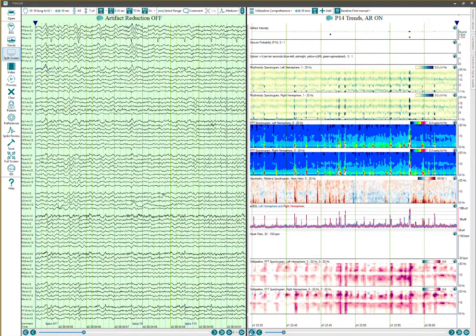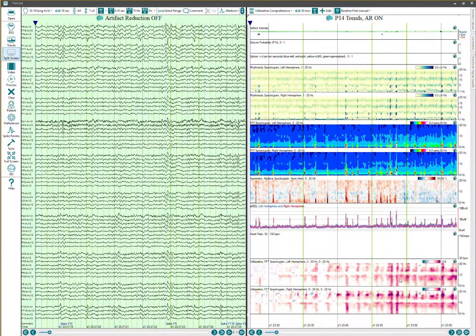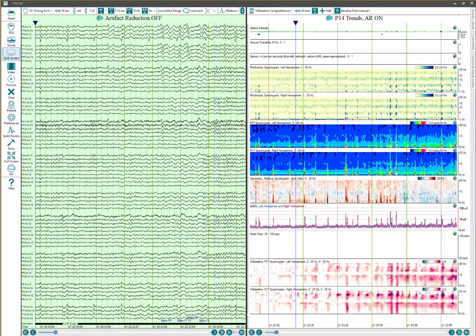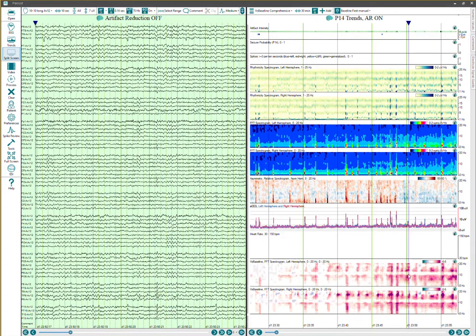that reflect the underlying EEG a bit easier. Something to notice, the versus baseline, I'll go ahead and page this back. There's the baseline that's set here that calculates the empirical null. And we're showing z-scores, red for positive z-scores, green for negative z-scores. Since this is based on that empirical null calculated from the EEG itself, you'll notice that you don't really have to adjust gain very much on these because it's showing a difference from that baseline, so it's normalized automatically.